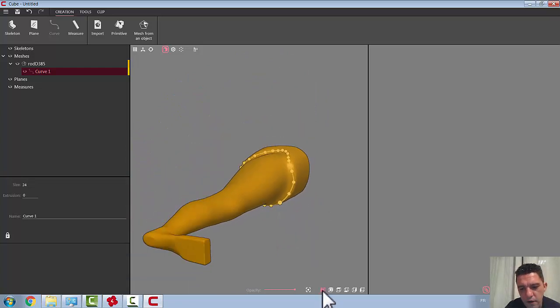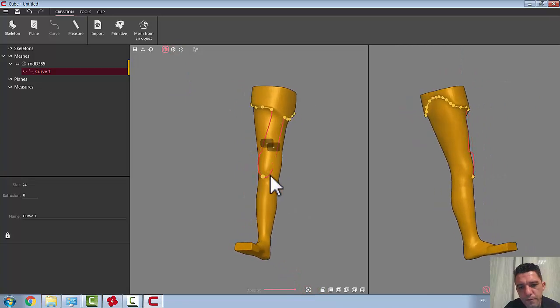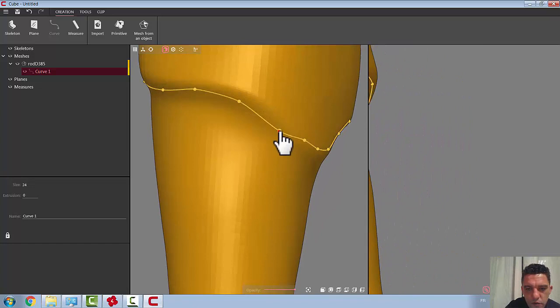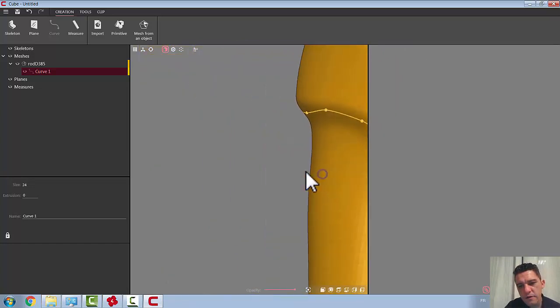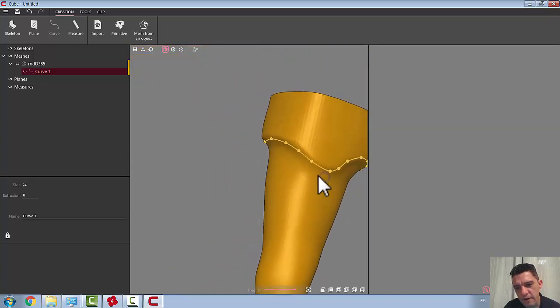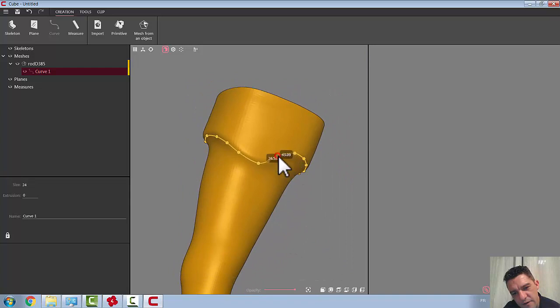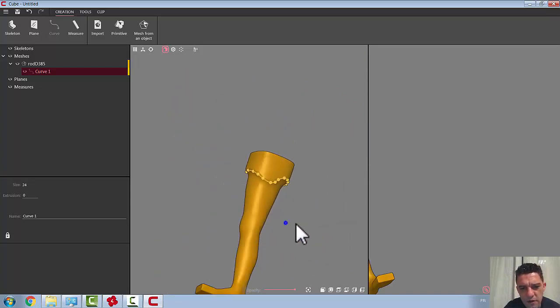I want to, let me click on the front view. Okay, good. Sometimes you want to go very fast and you have some problems. I have problems because when I import, I didn't align, so it takes more time, but anyway, I think it's more or less okay.